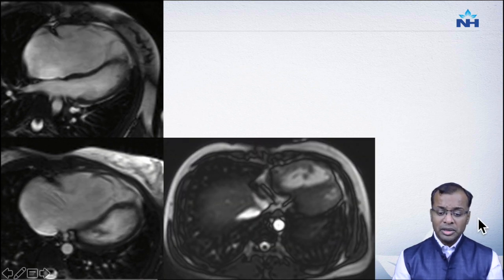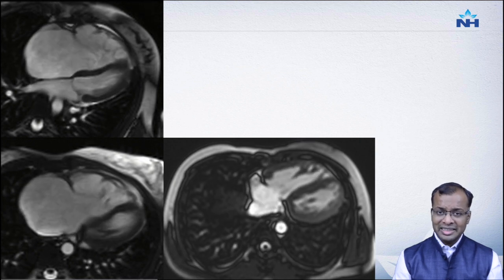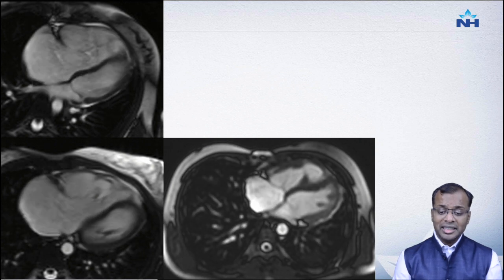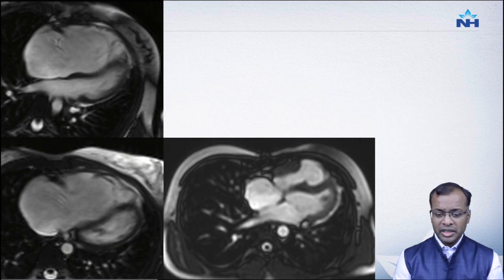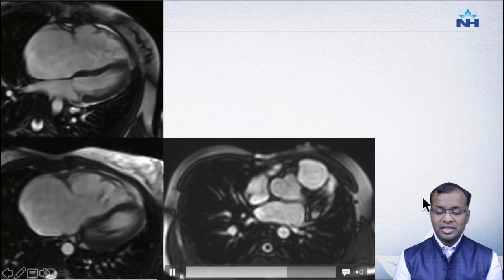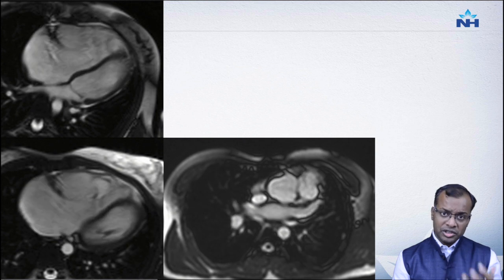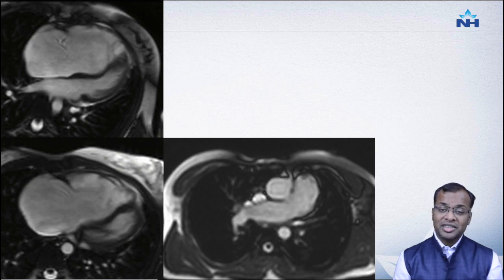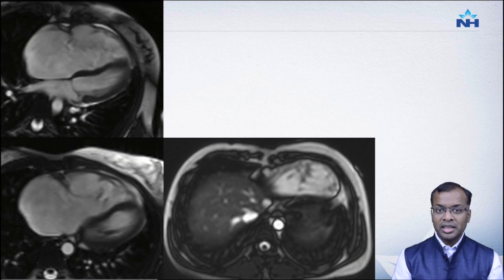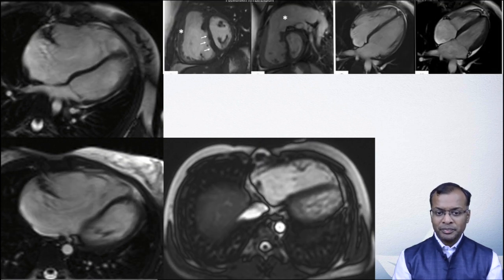Another patient where we look at the RV, this was a child in his teens, and we would see that the RV is actually dilated and focal areas are not working well. You can start to wonder, is this aneurysmal dilatation? And then you look at the history. This was a patient of tetralogy of Fallot who's had an intracardiac repair. So this was an RV to PA conduit, which is what is aneurysmal in this patient.